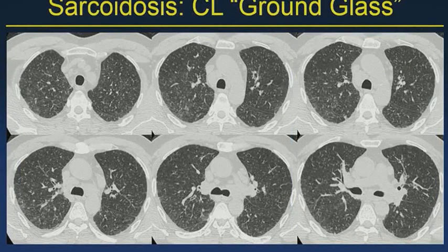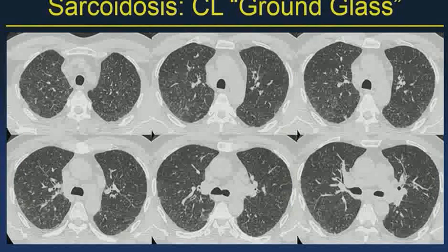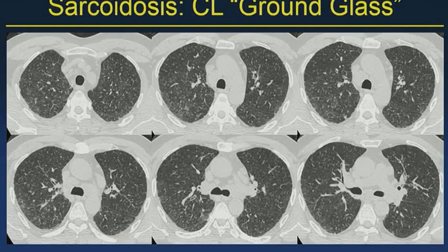There's another patient with path-proven sarcoid. Some of the nodules appear to be perilymphatic in distribution, as you can see here. Some are soft tissue attenuation, but in other areas you have more centrilobular areas of ground glass attenuation, simulating the appearance, for example, of hypersensitivity pneumonitis, but this is another patient with sarcoid.